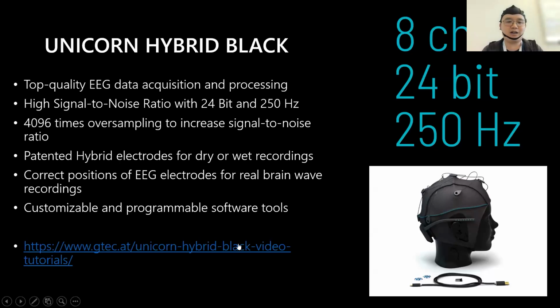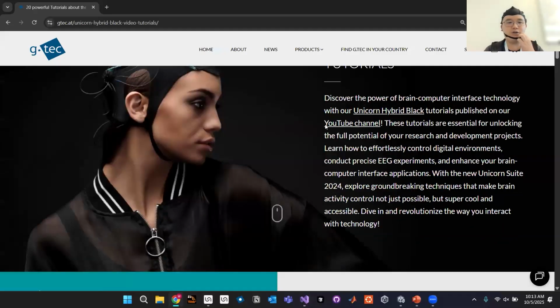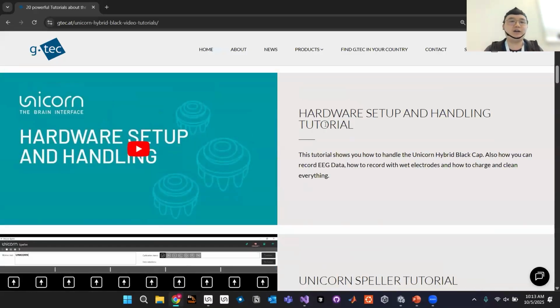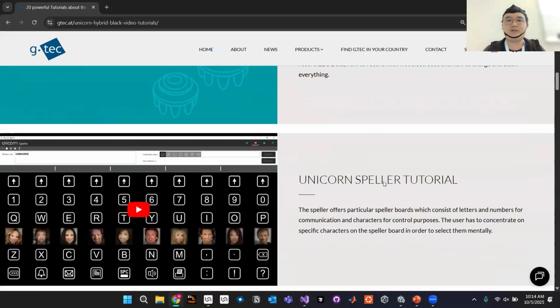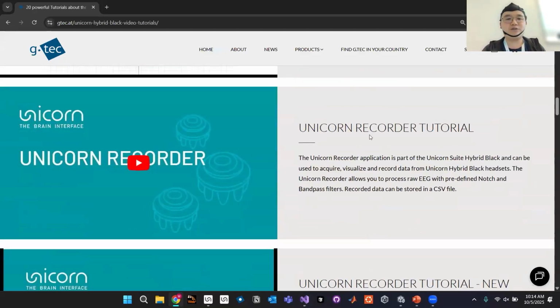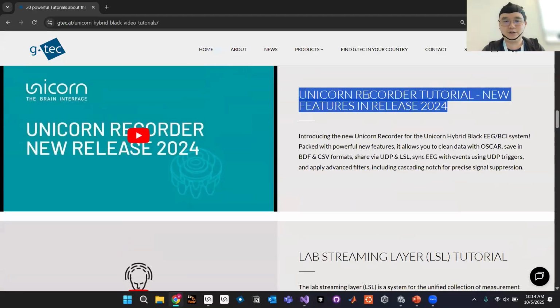If you look at this site, which I particularly linked here, it shows you all the tutorials that we currently have at g.tec. It provides introductions to the Unicorn Suite and how you set up the hardware, and what we have been showing recently about how to get the best EEG out of the Unicorn Hybrid Black. We have introductions to the speller, in case you want to use a P300 speller for your own application. If you don't remember how to use the recorder, you can see the tutorial as well. And this is the latest release, so I think you have to refer to this one.